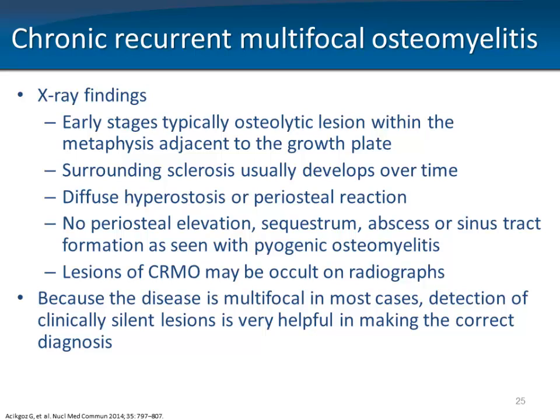However, some lesions can be occult on radiographs, and that is, of course, why bone scan is useful, because the disease is multifocal. In fact, it's part of the definition. And bone scan can detect these clinically or radiographically silent lesions.